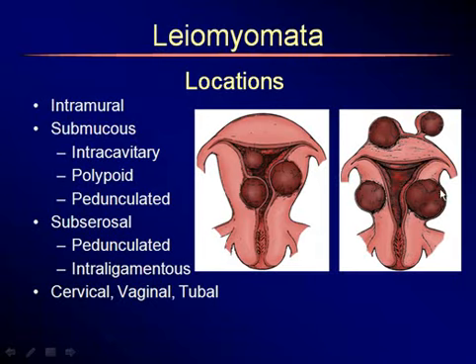If the fibroid gets very large and abuts the mucosa and serosa, then it's a transmural fibroid with a small submucosal and subserosal component. That's important for the clinician because if you describe it that way, they know they're not going to be able to get this out hysteroscopically nor laparoscopically.